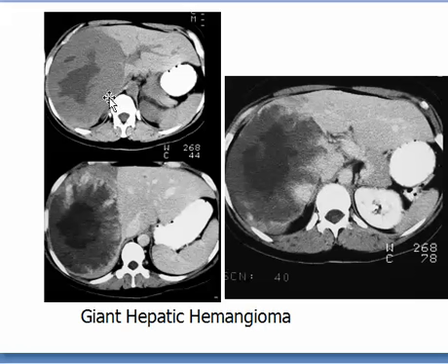Again, this is a giant one with different appearance. It's not homogeneous. It can present a necrotic center because of the large size, but still we have the nodular margins starting to appear from the margin creeping inward, and in delayed images we have larger patches of contrast enhancement along the margin, with a relative trial to fill this big mass with contrast.